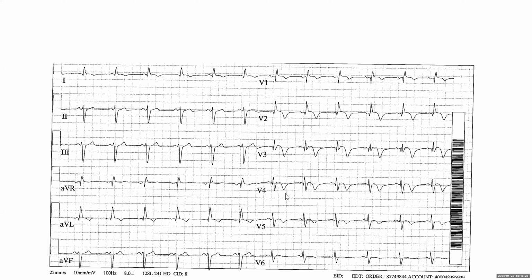Good. So agree: sinus rhythm, right bundle branch block complete. I'll come back to the RBBB business. There's left axis deviation, there's left anterior fascicular block, there's ST-T changes, there's anterior MI. Good, all these are correct. So let's go back to your questions, your answers.